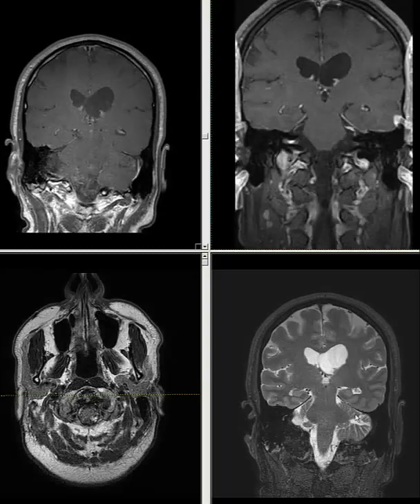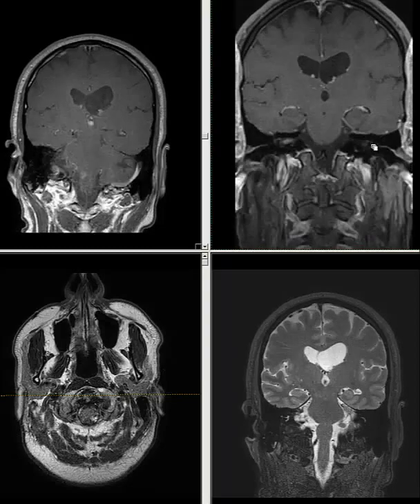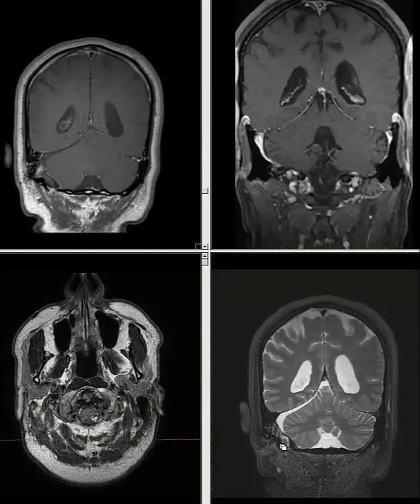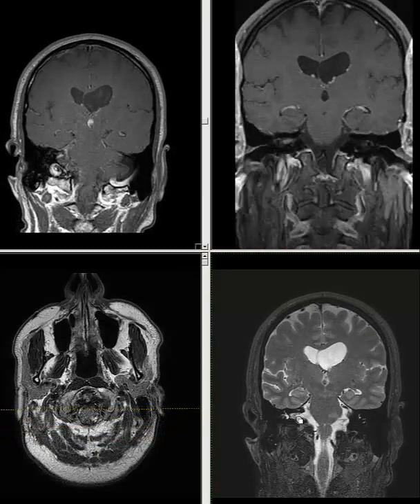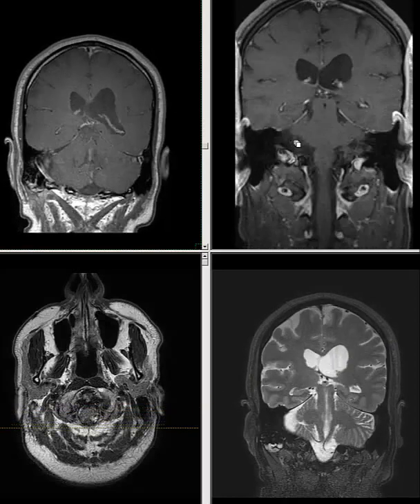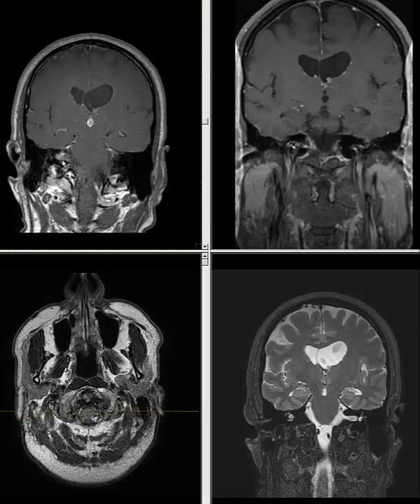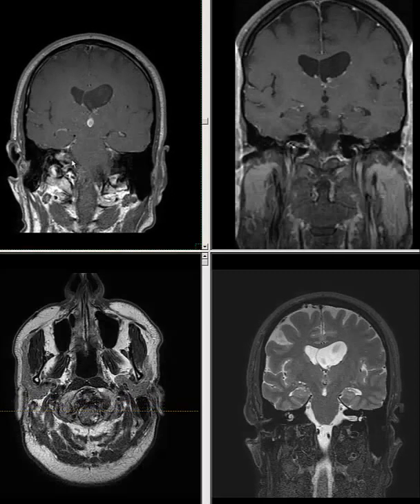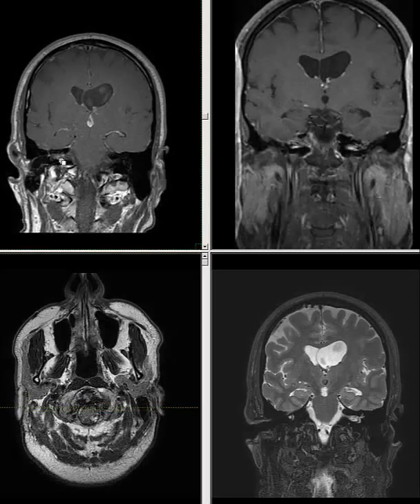These three pictures are the December 2012 MRI studies. They are in the same study. This is a comparison. Now, the patient had a surgery, which happened right here. The bone was removed, and the internal auditory canal tumor is smaller than before. This is before, this is now. I didn't show you the picture that's really large, that's protruding into the cerebellopontine angle. So basically this tumor is smaller because of surgery.